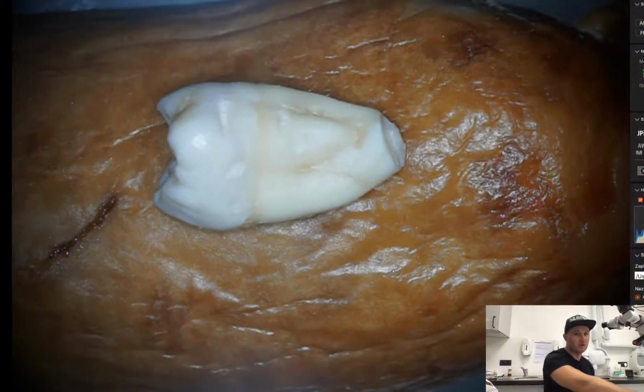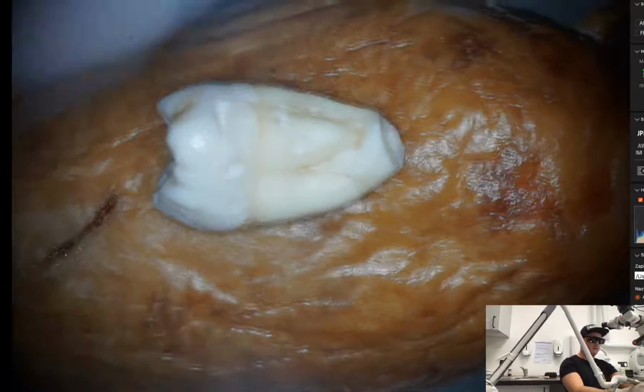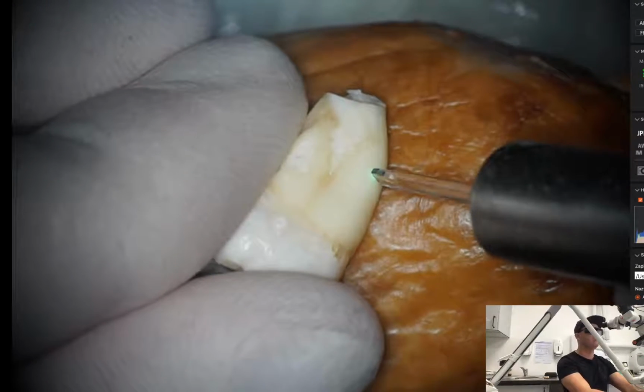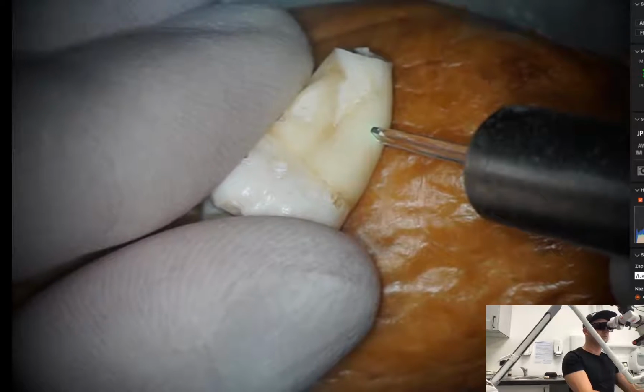So let me just show you. We have our patient again, as shown before: an extracted third molar and the Polish sausage that will stand for soft tissues. The extracted molar will be hard tissues. Here we have our root surface, and I will show you one impulse.